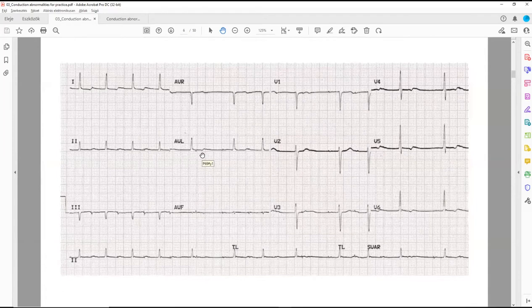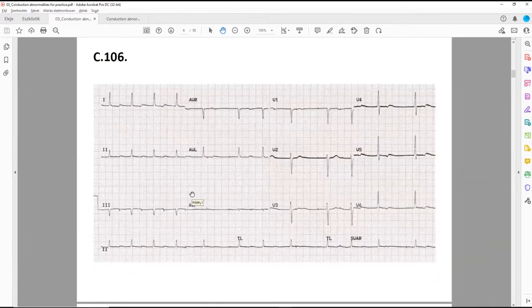If you have a spike at the QRS, that's a ventricular pacemaker. If you have it at the P wave or close to the P, that's an atrial pacemaker. I have separate videos about pacemakers, maybe in ischemic heart disease or somewhere there, I don't know exactly. I will show you, and you can revise these pacemakers as well. But that's a tricky ECG, a tricky one, but you did it very nicely.